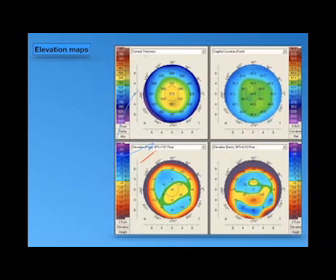Again, +15 is a point of acceptance. Beyond, some authors said that +18 is the margin of acceptance in the myopic and +21 in hyperopia. But actually the margin from +15 to +21 is highly suspicious in both, but it could be accepted in the hyperopic more than the myopic, especially if the other points are within normal. There are no other risk factors in this patient.